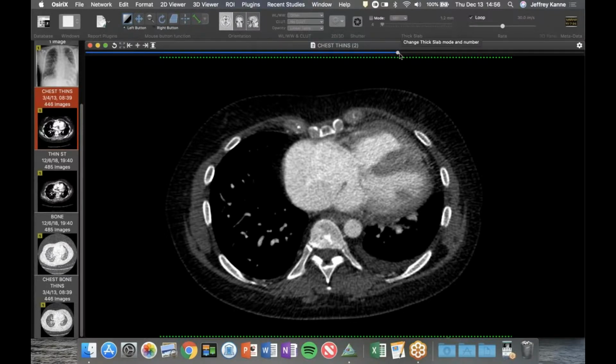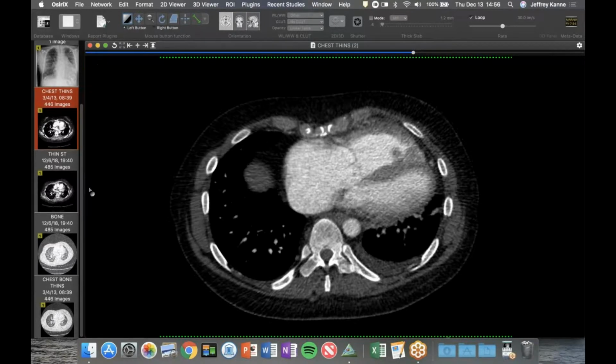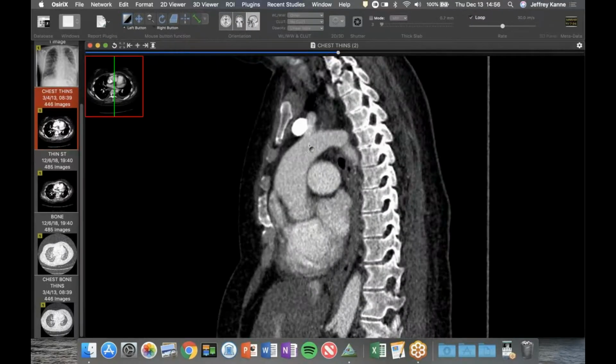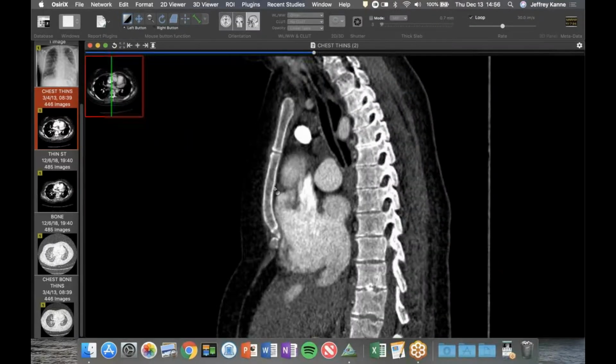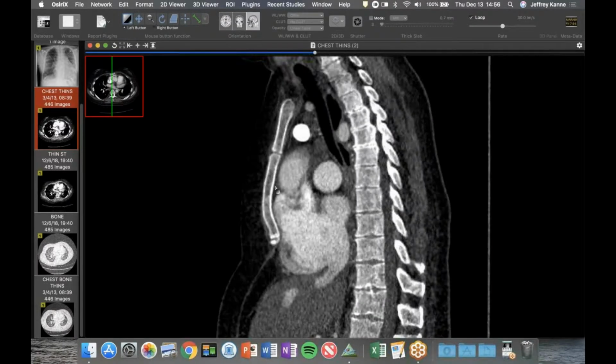Patient also has 11 pairs of ribs, which can happen. And then they can also get a hypersegmented sternum. She doesn't, well, hers is fused, but I'll just pull it up real quickly. It looks like at least at some point there was another ossification center in that sternum. Hard to say for certain, but yeah, so 3 shunts: ASD, VSD, and a PDA, long-standing untreated.